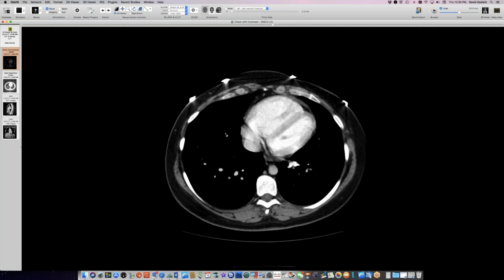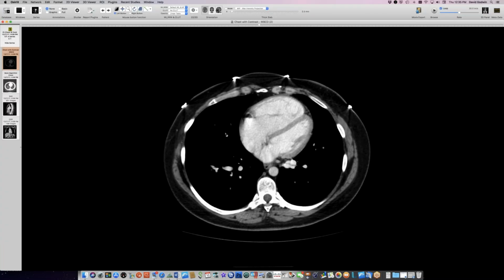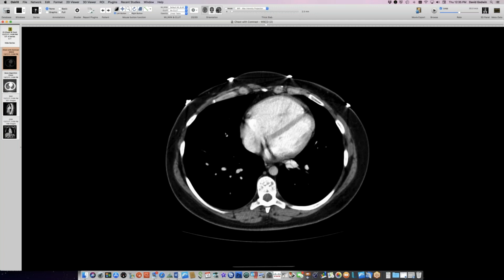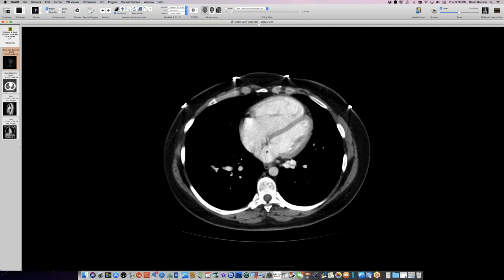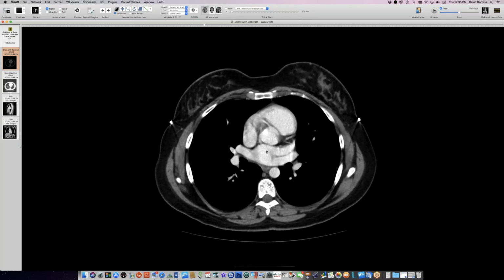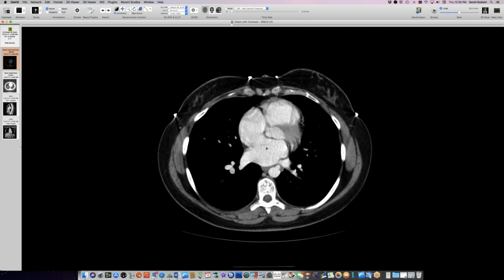Like right in there, actually. Is there a large secundum atrial septal defect? Look how large that right ventricle is. It looks like shunt vascularity. And then in the mid, it was actually a little bit lower in the septum, not the sinus venosus, but it looked like the mid interatrial septum. You just lose that, it's right there. Yeah, you're absolutely right. There is an ASD here. Yeah, and that was part of the diagnosis too. That was mentioned in the CT report. So I think it's a secundum ASD.